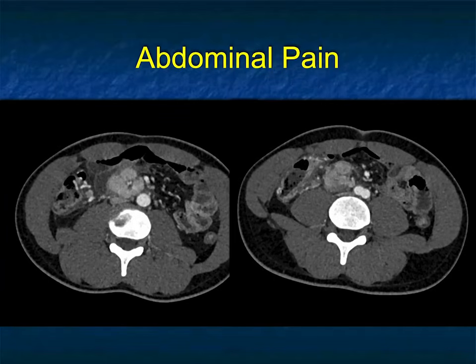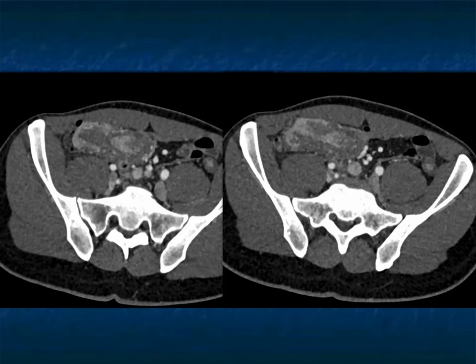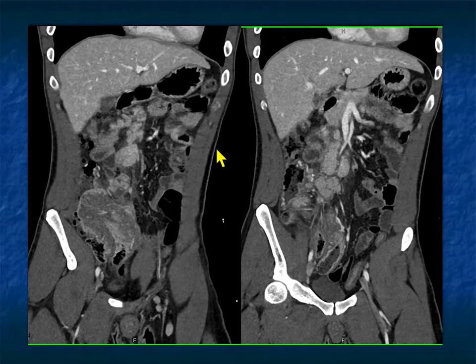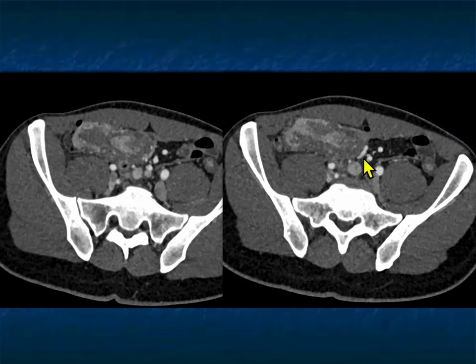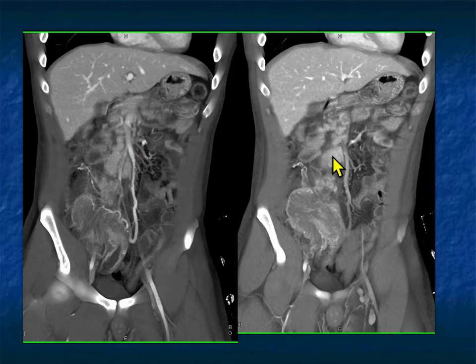Now, speaking about difficult diagnosis, here's a case I saw with abdominal pain, bowel obstruction, mesenteric nodes, which are enhancing, and then there's distally thickened small bowel with enhancement, but looks mass-like. So I'm thinking there's a mass in the distal small bowel. Maybe this is lymphoma because it's bulky, and particularly because the patient had significant adenopathy. There's the mass-like process of thickening of bowel, infiltration of bowel. There's the multiple nodes we saw and see again right here and see here.